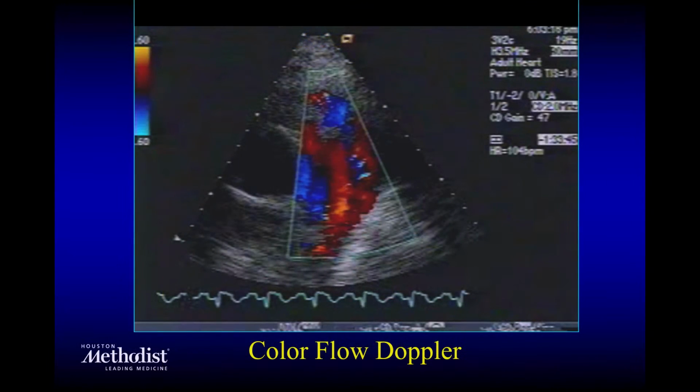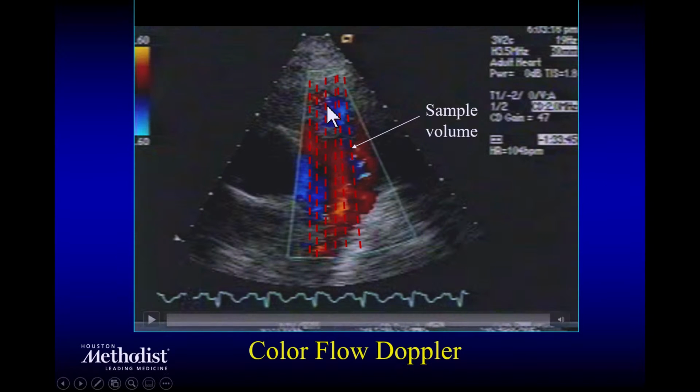Okay. Now this is color Doppler, and color Doppler is actually a poor man's method of pulse Doppler. And why? Because we wanted information as to the direction, if you will, and maybe the velocity. And this is an estimate of the velocity, so you can think of multiple sample volumes right here throughout these scan lines.